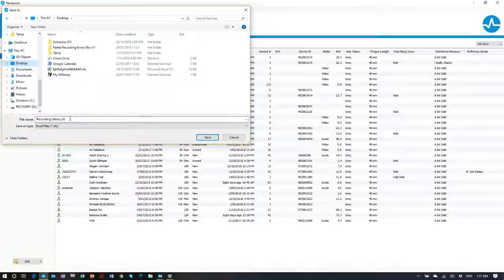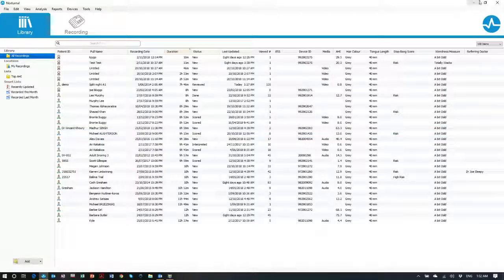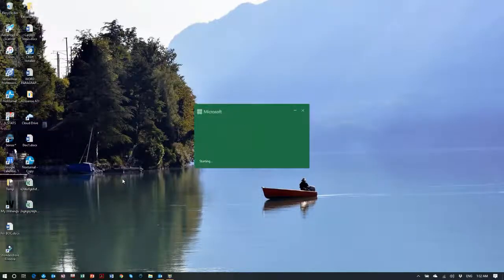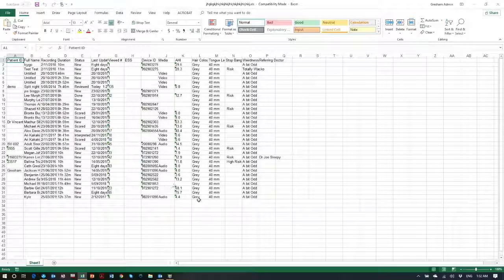Let's give it some long involved name. Probably not. Punctuation is probably not a good thing to have in there. And so that we can find it easily, hit save. Then find it. And I think it's that one that I just created, because I created one earlier. And then you can do all your statistical analysis on your choice of any column, your choice of any studies, your choice of any sortings.